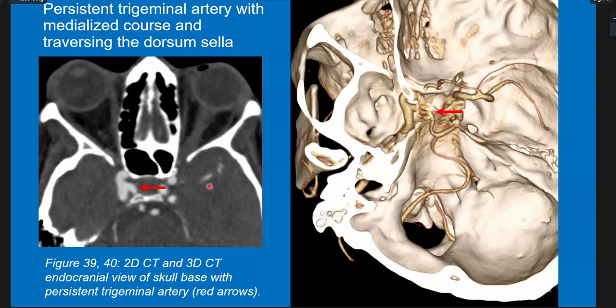Here's another example of an anatomic variant.